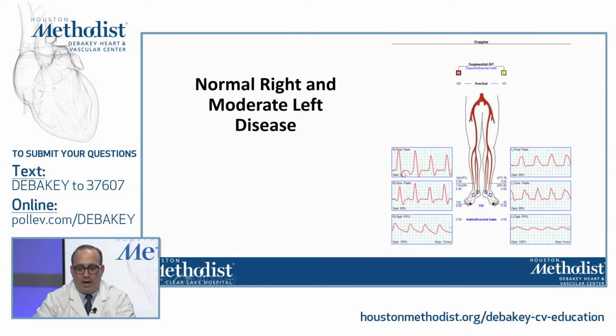So let's start looking at the right leg. First, I like to always look at what I expect. Do I expect to see a normal vessel, what a normal vessel looks like? And then I look at what I'm seeing, and is that within the expectation? So normally, I would expect to see a normal vessel. So here, essentially, we have almost a normal vessel. We tend to lose the antegrade diastolic flow slightly. So this is a biphasic, more likely almost triphasic waveform.